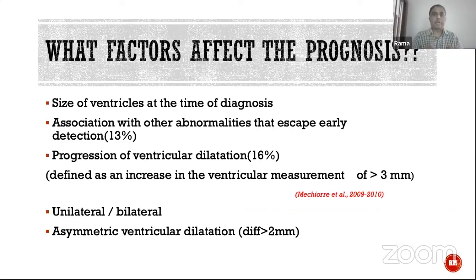I say perfect because at 26 weeks, there are some landmarks that one has to demonstrate on ultrasound or MRI. The parieto-occipital fissure and calcarine fissure are grade 3. That means they are narrower but longer, whereas grade 2 is broader but shorter.